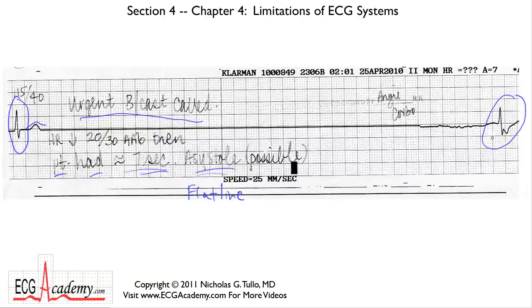Well, here's what you need to know. The size of this ECG is on the order of 1,000th of a volt. It's tiny, tiny, tiny. And what the ECG machine is trying to do is pick up these little tiny electrical signals from the skin. But it can pick up other electrical signals as well from the skin or from the muscle or from just the patient moving around or breathing. And what you can see, for example, from here to here is this very fine undulation, this little random noisy signal, which we call the baseline.